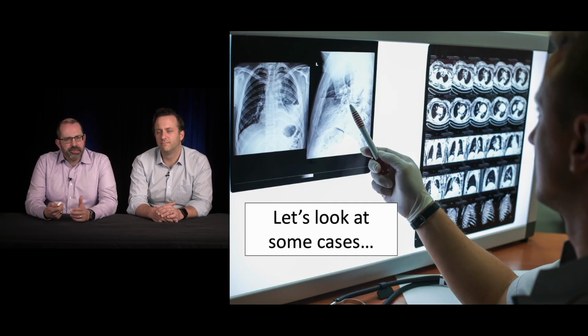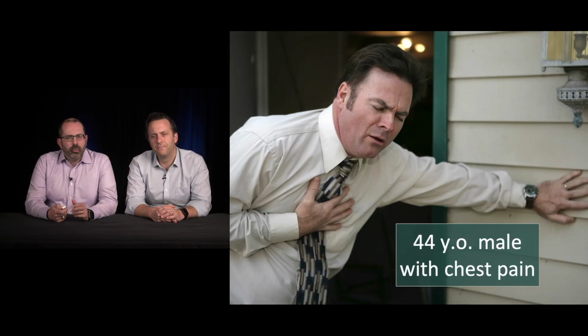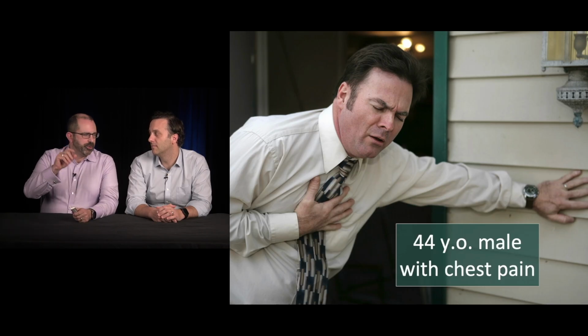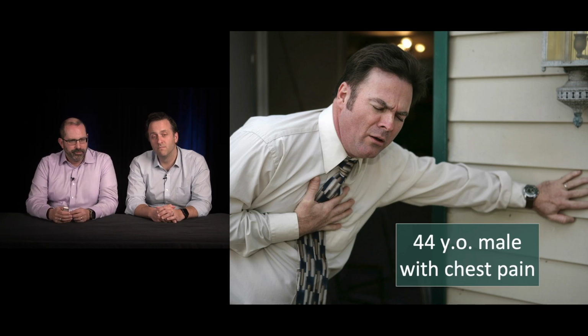All right, let's jump into some cases. So with these cases, I'm going to try and give you a lot of slices. Like I hate going to a talk and they'll be like, here's the pathology, and they give you just the money shot. I really want to go through some of these CTs in detail to sort of give you that experience of having to look at it yourself. So get ready. I'm ready.